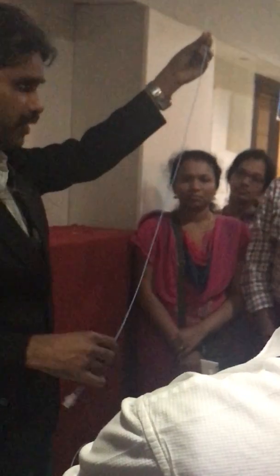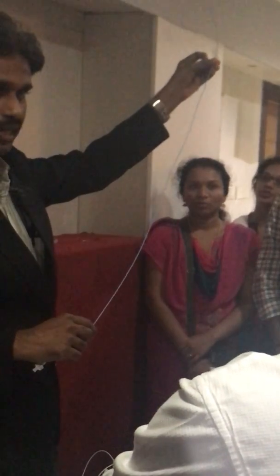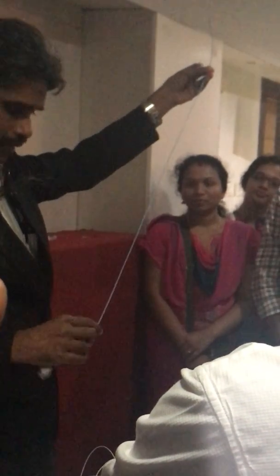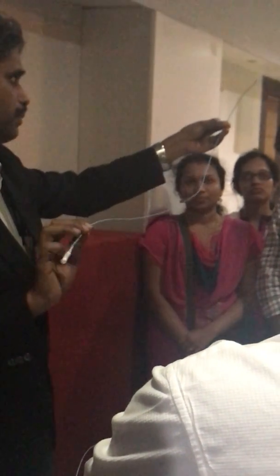So what is this catheter? It's called the angiographic pigtail catheter. Remember that there is one more pigtail catheter. Where else is it used? Drainage, abscess. That's not angiographic. So that is a pigtail catheter. Just look at the size. This is a very small one. So this is the angiographic pigtail catheter.